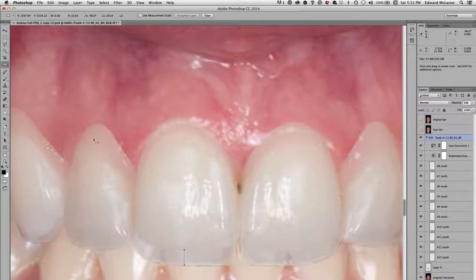All right, now I would do the same thing at the lateral. So let's go over here. Let's hold down the shift key. I'll do this a little faster, to about right there is where the gingiva needs to move from. So 39, we divide 39 into 16 and we come up with about 2.3 millimeters, 2.4 roughly. So we know we want to come up about here. That's where we'd wax to and then maybe eventually cut to.